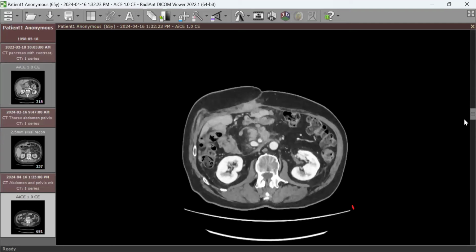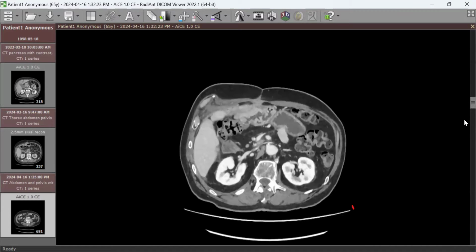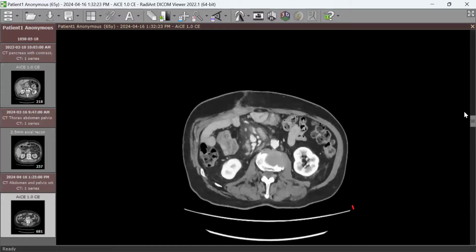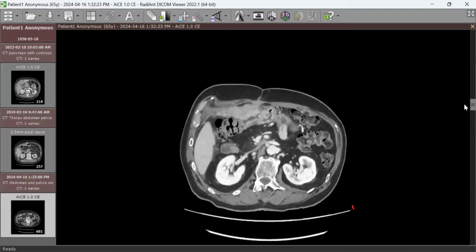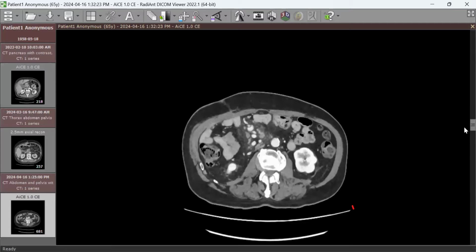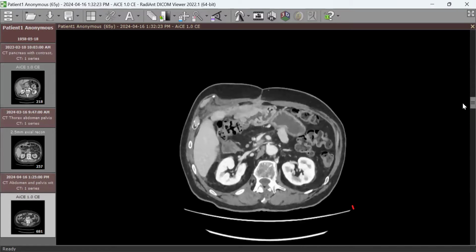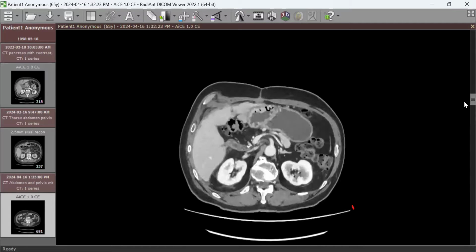These lesions around the vessels, what are they? Maybe they could be recurrence or lymph nodes. Yeah, they are lymph nodes. Definitely there is recurrence. The lymph nodes are enlarging here, surrounding the vessels. Exactly. Now, so the patient had these lymph nodes. There is recurrence of the malignant process. In addition to that, the patient had repeated vomiting. So what's the cause of repeated vomiting here?